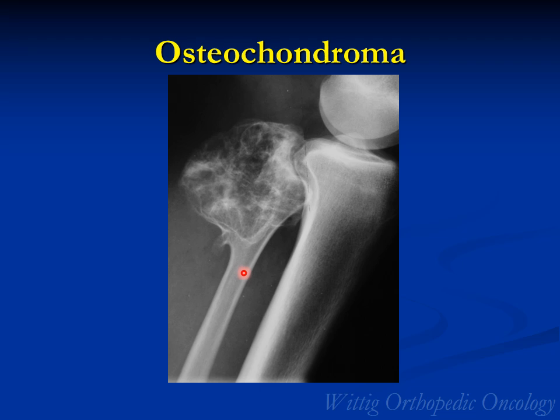This is an osteochondroma. It's grown from the proximal fibula. You can tell this is an osteochondroma because there is corticomedullary continuity. You can see here the cortex extending into the osteochondroma with the medullary canal. This is the cartilaginous cap, and you can see here areas of mineralization, the calcifications that are occurring in a stippled and in a flocculent manner with rings and arcs. Very indicative of a cartilage tumor or hyaline cartilage tumor, and put that together with the corticomedullary continuity, and very suggestive of an osteochondroma.